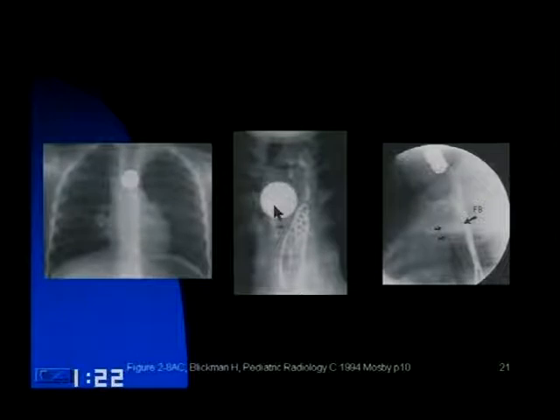And here we have a radiopaque foreign body, metallic, which has actually eroded through the esophagus itself. You can see the barium column, and a separate column on the other side, which is secondary to abscess formation. Here we have a toothpick posteriorly, which has caused mass effect, swelling, and inflammation, and has partially closed down the airway.